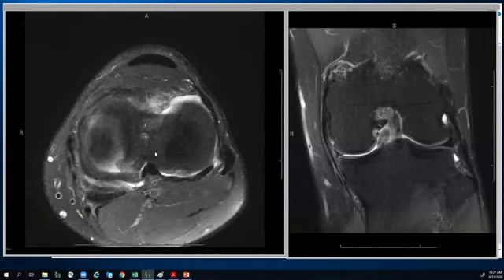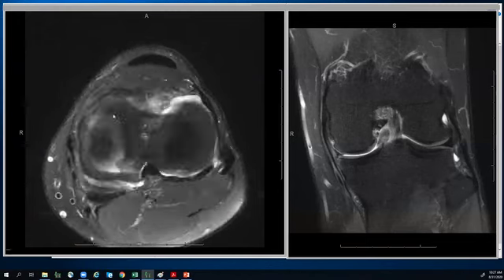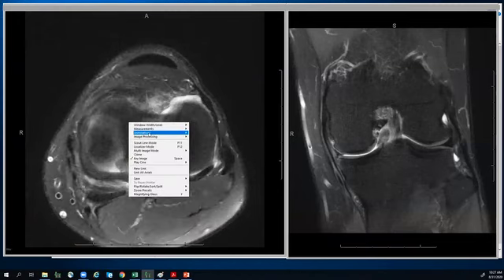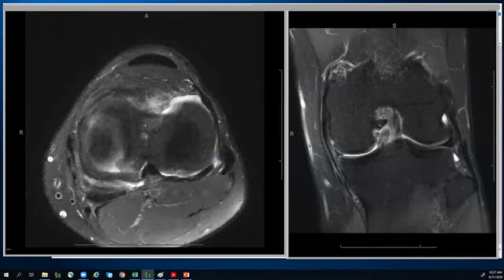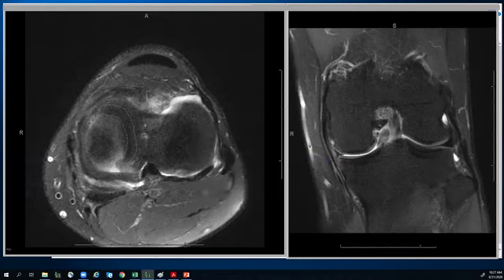Every so often you get a nice look at these in the axial plane. I have seen better examples, but I wanted to specifically include this example. After a while, you get used to looking at these things and it makes sense. But right here in the medial meniscus, as I pan between these two slices, I see the handle of the bucket handle tear, where the native strip of the meniscus material has been markedly reduced.